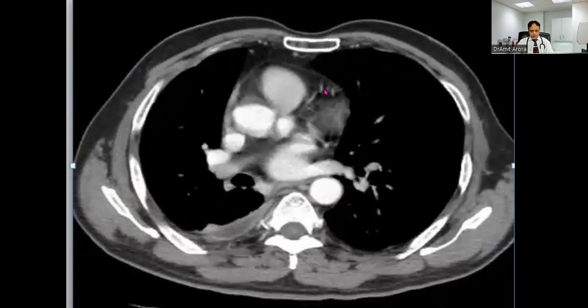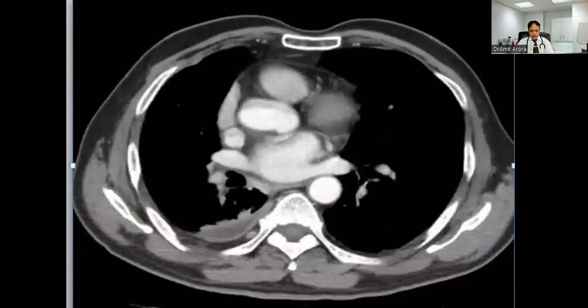If we move slowly a little bit. One important part I would like to tell you is the left atrium, posterior most side. It's appearing over here, and in the lower section you can see this is the right ventricle. Right ventricle forms most of the anterior part of the heart. This is part of the right atrium, and this is the superior vena cava. Superior vena cava will be draining to the right atrium, and in further lower section the right atrium will be available and the superior vena cava will disappear. And this is the descending aorta, and this is the ascending aorta.